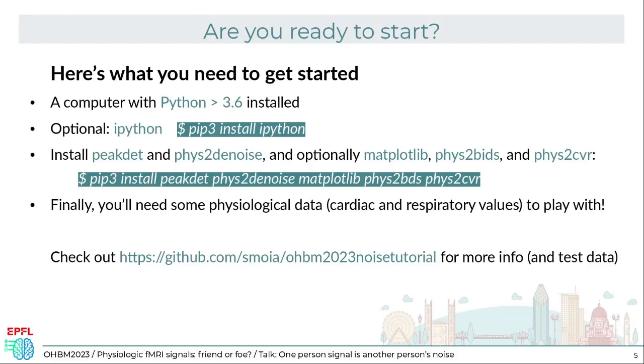Optionally, you want to use IPython. I will be using IPython from my terminal. IPython is an enriched terminal for Python. You can install it with pip, with PyPI. So it's pip install IPython.